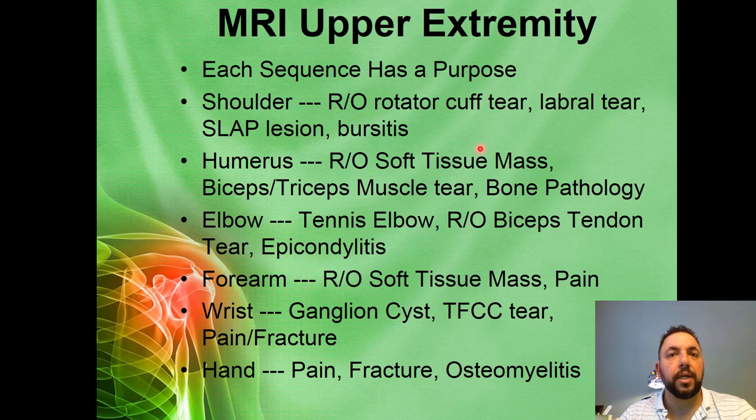So in the shoulder, common indications or applications are to rule out rotator cuff tear, one of the most common applications of shoulder MR. Labral tear, SLAP lesion, we'll discuss and define what is a SLAP lesion, bursitis.